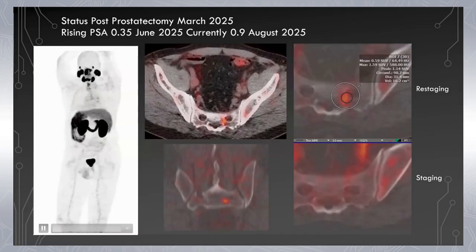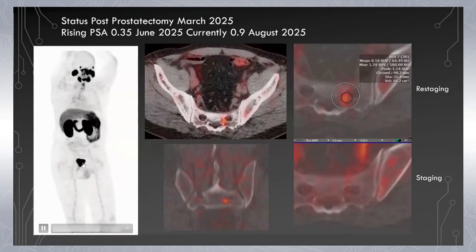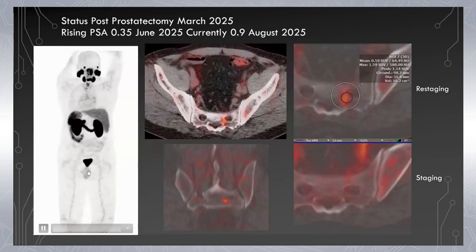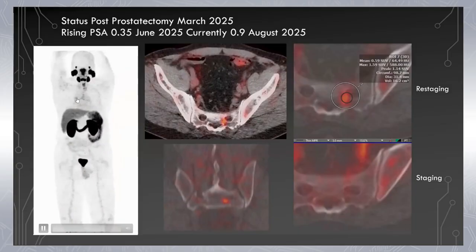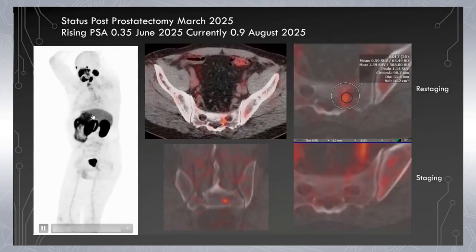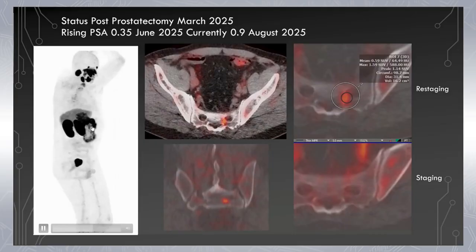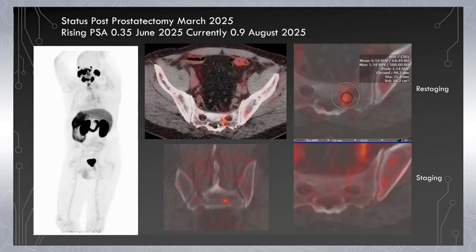Let's look at this patient's rotating MIP. Patient's status post-prostatectomy, radiotracer uptake within the urinary bladder, but no uptake at the prostate bed. But if we look very carefully, we see that there's a solitary focus of uptake posteriorly on the MIP. Lower level uptake in the liver and spleen, physiologic uptake otherwise within the salivary tissues, as well as within the genitourinary system. We look very carefully for that focus of uptake on the axial fused image.